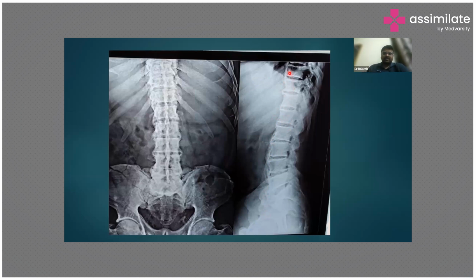Now look at the alignment. So basically, what we are looking at is the lumbar vertebrae. Adequacy involves the upper sacrum, so that is adequate. And then alignment. So if you draw a straight line along the anterior vertebral line, it seems aligned, but when it comes to the lower vertebral bodies, there is a slight drop in the alignment, especially down here. Now, if you trace the posterior vertebral line, yes, again, the alignment is lost here.